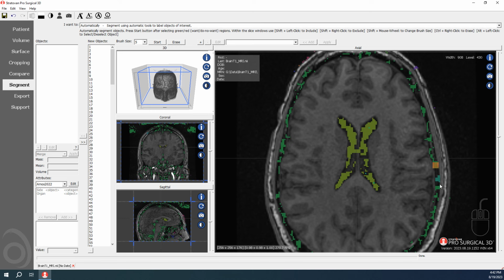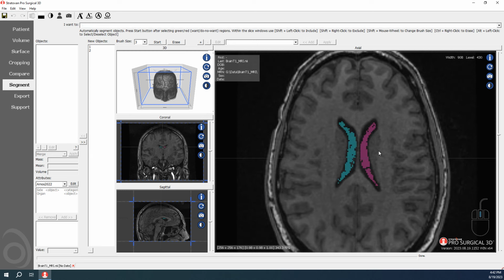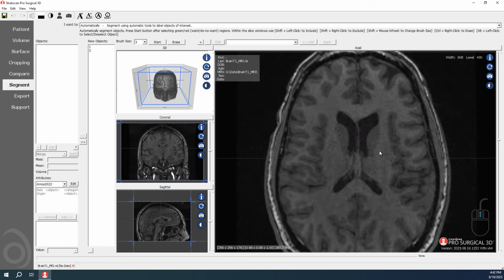And in this case, we don't want this stuff over here, so I marked a region over there, and I can restart the segmentation here and see how it does. And it's now sort of going back the other direction. We can add a couple points there. Now we're getting closer to something that is more in line with what we want. So we can scroll through and say, I maybe want a little bit more over here.